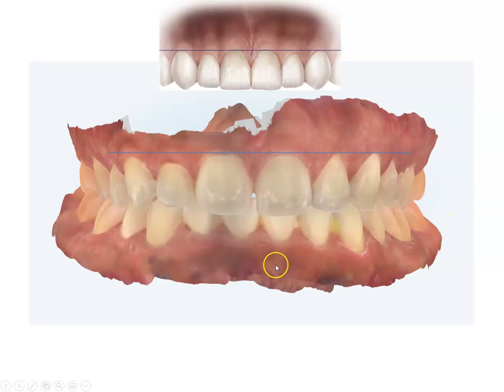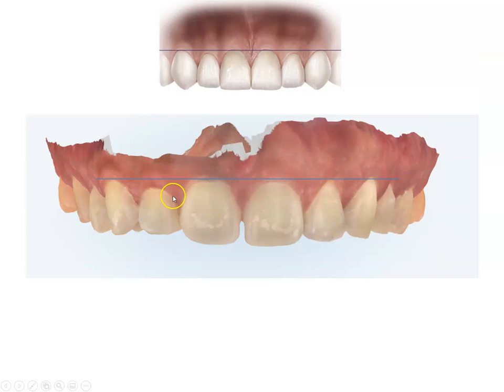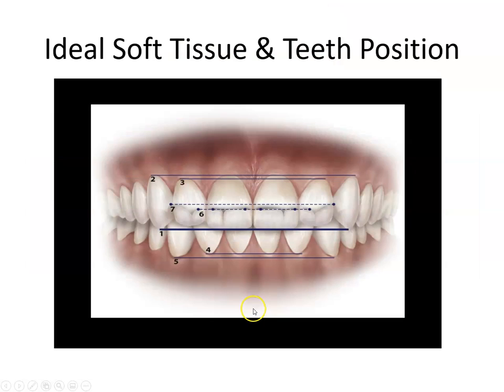So now we've covered the lower position of the teeth, the top, and the gum position. Now let's look at what we need to do. Here's a quick error just to demonstrate that ideally we would want the gum to be lower here, and we would want these two teeth to be shifted up. And the same thing if we look at it without the lower teeth. Here we see the lower teeth, here's without the teeth. We have the same overview.